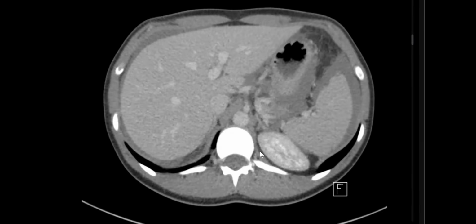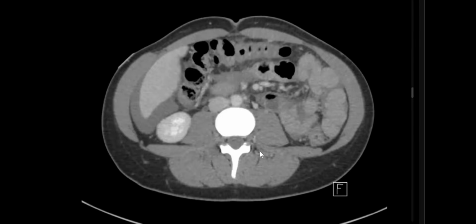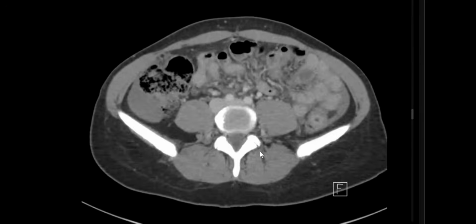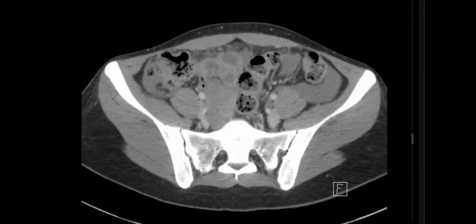Good. In a patient complaining of pelvic pain, some examiners will tell you, please do not repeat the complaint. Okay, no problem. With acute pelvic pain. I'm scrolling from the first cut till the last cut. You have to continue talking in the exam, don't avoid long stops. It will be negative and it will give you a minus in the communication marks.